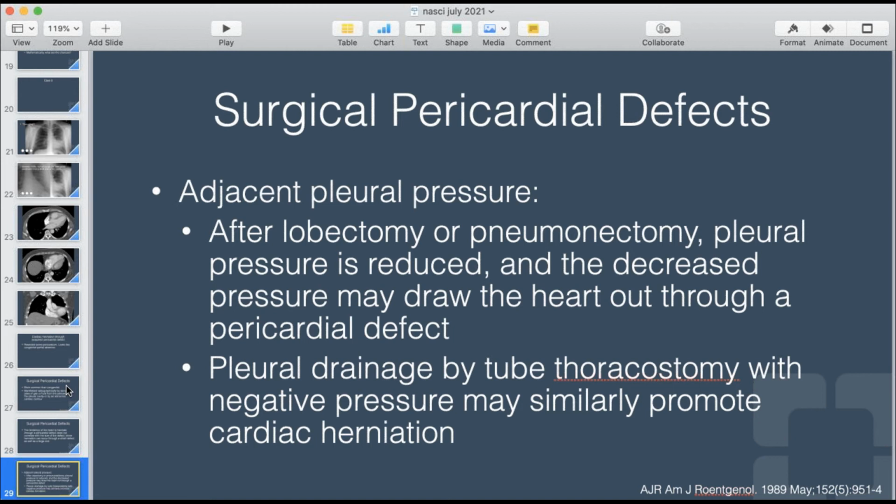You can see there's a waist to the contour of the ventricles here. You can see the pericardium proximally, but you don't really see the pericardial layer distally on this patient. Let's look at the coronal recon. And you see that left ventricle upturn, or elevation, that was not present before.